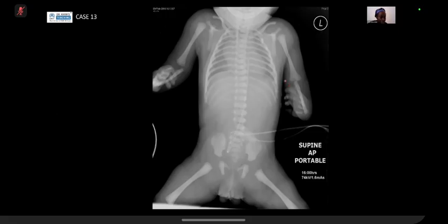In this case, the heart is enlarged and the child actually ended up having tetralogy of Fallot as well. If you have tetralogy of Fallot with a tracheoesophageal fistula, then in the UK we call it a double TOF, given the abbreviations. T is for tracheoesophageal fistula. So on this, we can see that there's no evidence of bowel gas in the abdomen or the stomach. There's no gas in the stomach, so there's no obvious fistula in this patient. E is for esophageal atresia. It should be O, but it's an E because it's an American spelling.